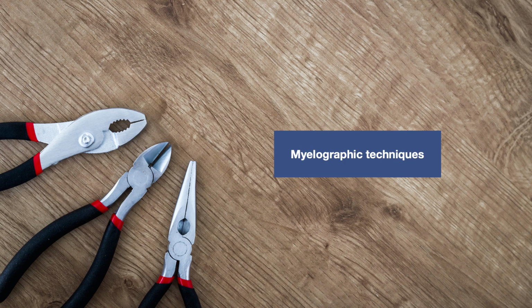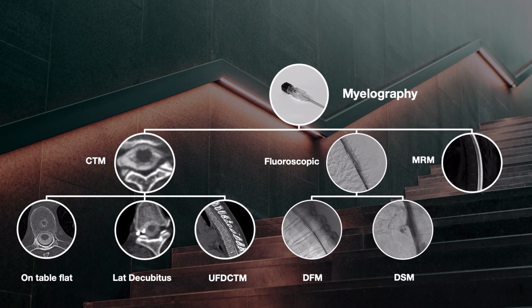Now remember these broad groupings of leak, let's have a look at how we find them. If we want to properly localize, that requires myelography. And this would be perhaps when conservative management measures and perhaps epidural blood patches have been tried and not been successful. It's really important that you choose the right myelographic technique for the leak etiology under suspicion. Otherwise, you may not be successful in locating the leak. Now, there's been a lot of progress made in advances in myelographic techniques in the last 10 years, and that has also led to advances in our understanding of causes of leaks, which has led to further iterative refinements in myelography.